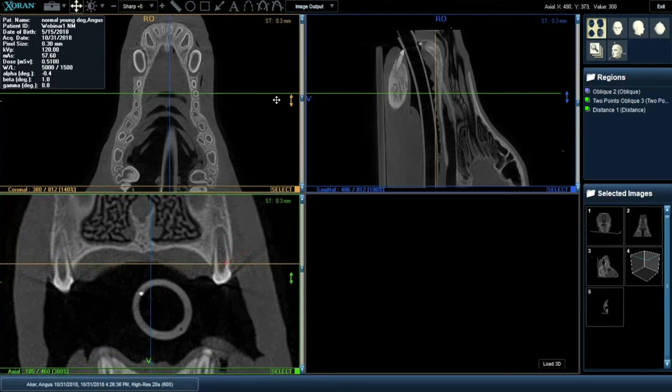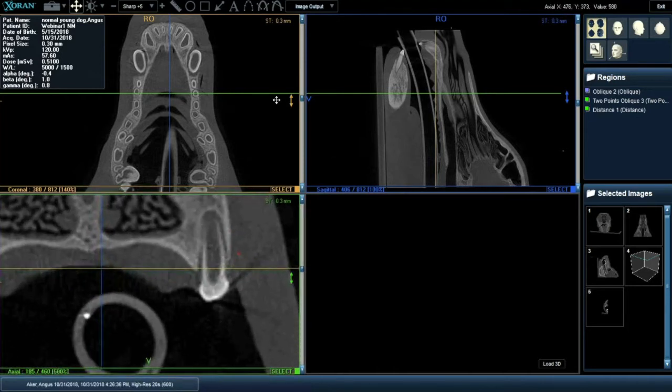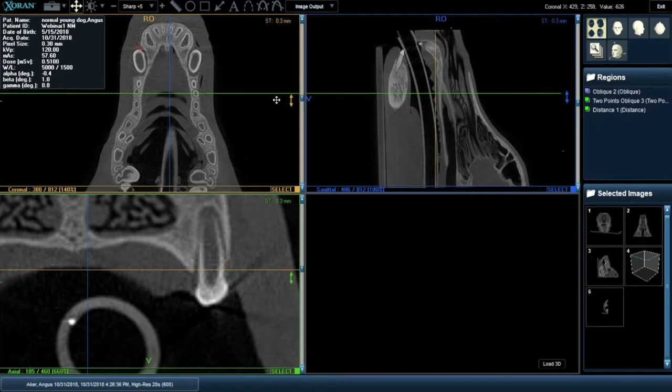Here's again bone level on the buccal and on the palatal aspect of this particular tooth. And we'll notice that this buccal bone is somewhat thick, but we can see it pretty well. We can zoom in and measure the distance between the crest of bone and the cemento-enamel junction. And it might be around 1.5 to 2.5 millimeter. And again, this distance can vary from place to place. Remember that on a VetCAT, when you do this sort of measurement, this measurement is in fact accurate. So here's 1.6 millimeter from the crest of bone to the cemento-enamel junction.